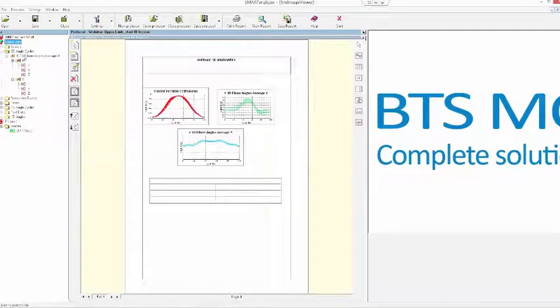So these variables are below the global data. So below time, I have the cycle, the average cycle time computed, and below 1D angle, I have, for example, the value of the range of motion.